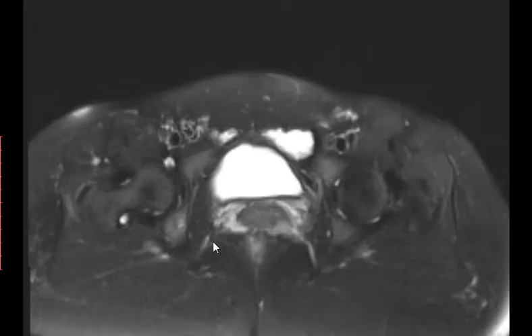Look at this case. Literally it's a case report. No one, including me, even guessed it. It didn't even cross my mind. Don't feel bad if you didn't get it. Pathologically we were all surprised, like what the hell is that. It's biopsy proven. This is a 32-year-old female patient presented with lower abdominal pain and things like that.